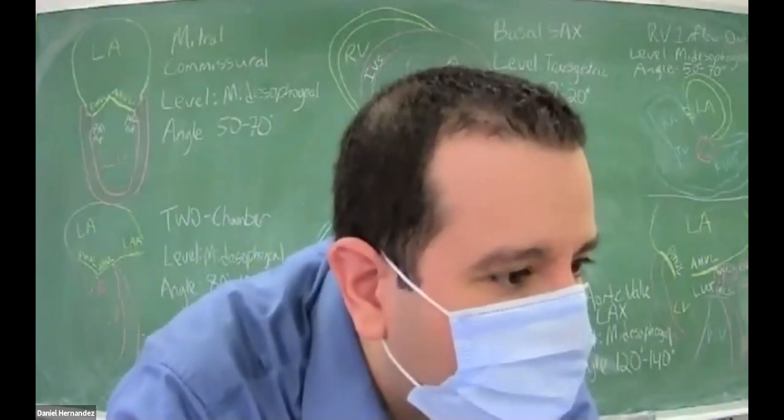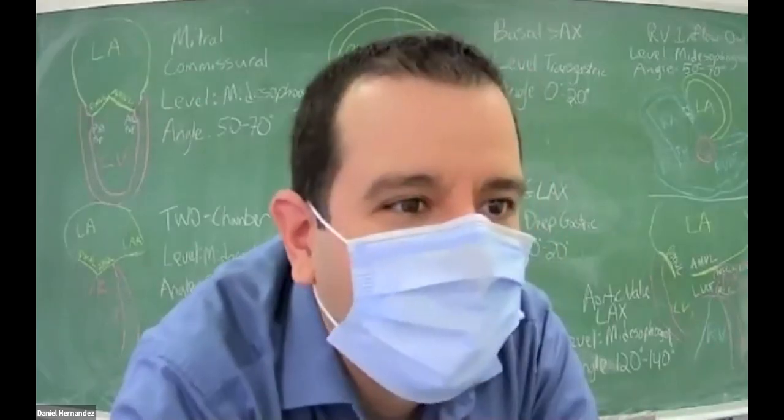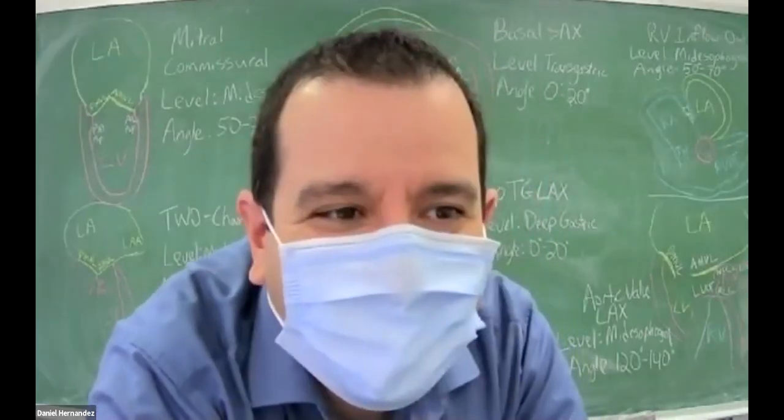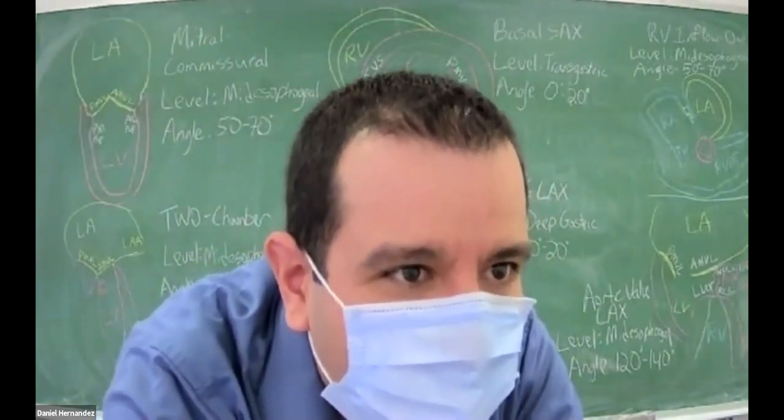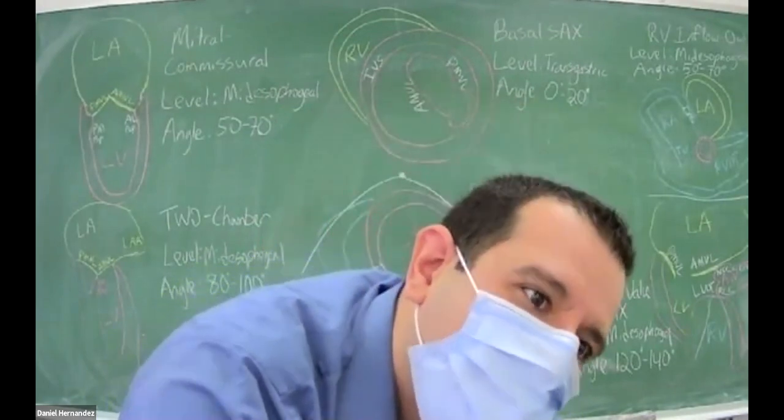Do you have an upper esophageal angle, Dan, for ascending? That's okay if not. I think I took a picture too. Let me see if I have it. Kind of looks like 90 degrees just based on the picture. Oh no, maybe a little less. So it looks like descending aorta is 90 degrees.